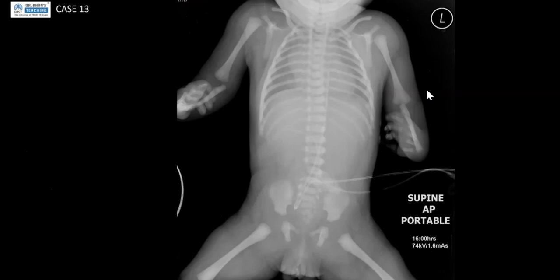Okay. So once you've made the diagnosis of esophageal atresia or tracheoesophageal fistula, there are other things that you're assessing for to make another diagnosis. What other things do you think you may be assessing the radiograph for? I think I was going with syndromic, a syndrome. I think it's VACTERL. Okay. So what things can you assess as part of VACTERL on this radiograph?